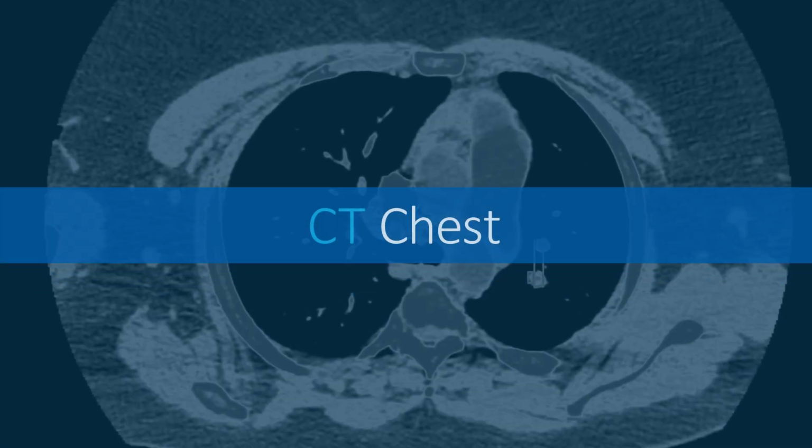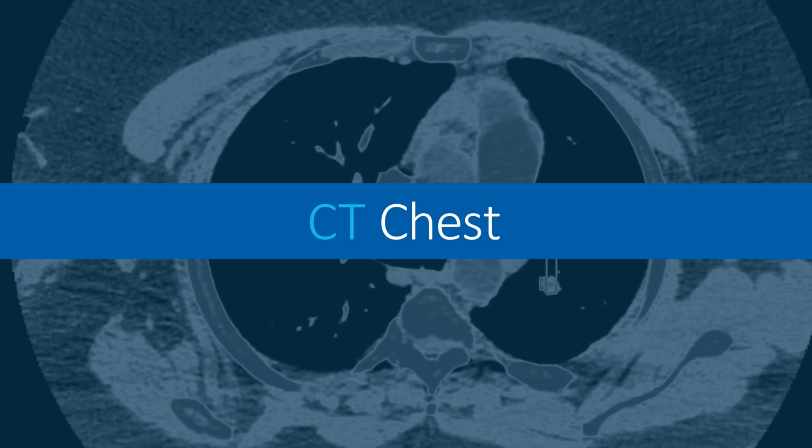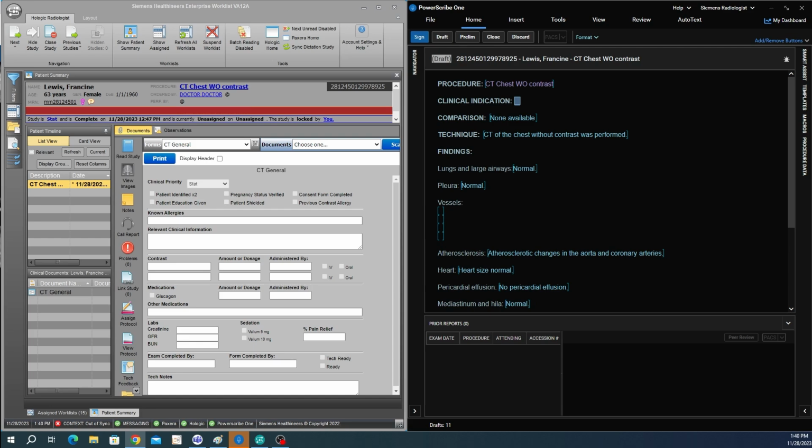Back to our clinical story. If you recall, Francine had an elevated D-dimer, and her chest X-ray results prompted the CT chest. The images for the CT are acquired and sent to the Paxera PACS for storage, and MONAI's AI orchestrator routes the CT study to the Telerad Tech PE Assist tool. Since Telerad Tech PE Assist tool flagged this study on the work list, not shown here, our radiologists know to open it as soon as possible to review potentially urgent findings.